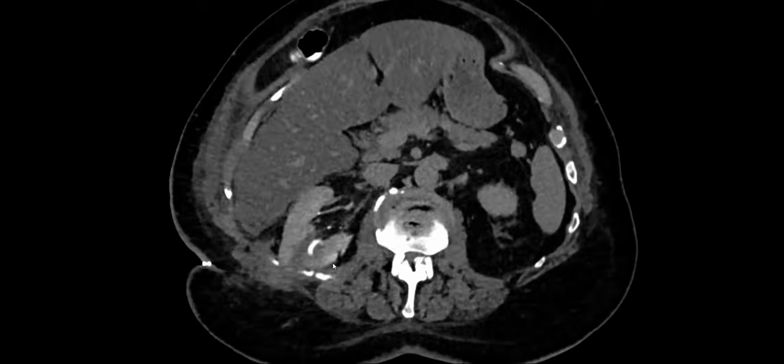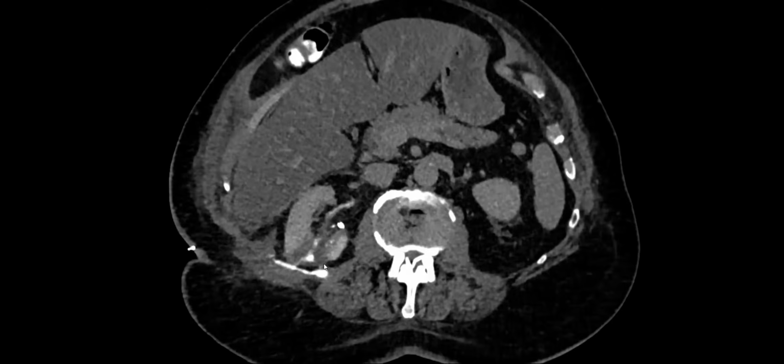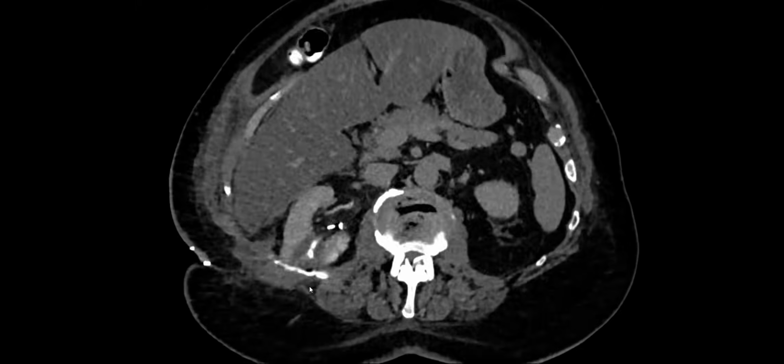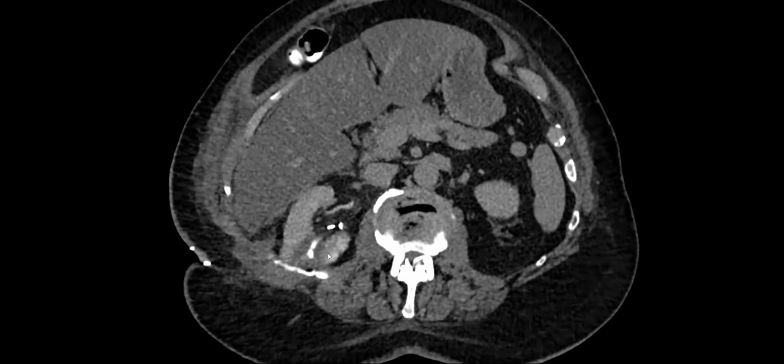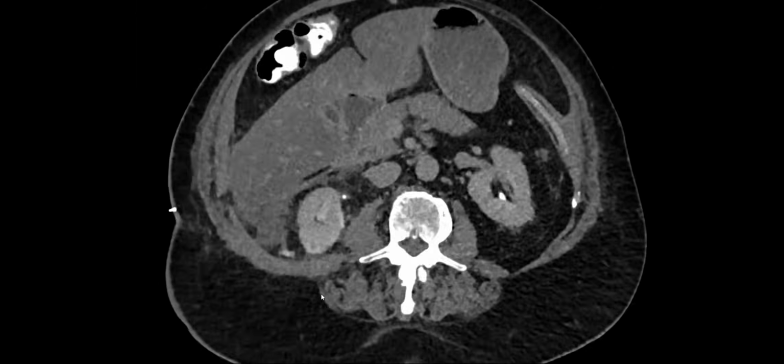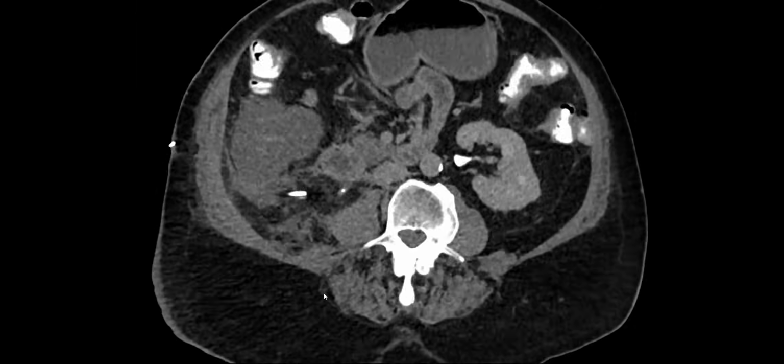I was also telling my residents, just for the students out there, even if you didn't protocol this as a urogram, if you're ever worried about a urine leak, you can always bring the patient back later that day or an hour later, including in trauma scans, because the contrast is going to be excreting for up to 12 to 18 hours afterwards, so you can see that leak even on a delayed scan. I've done that before, where it's a portal venous phase, and then I bring them back for a delayed scan, and then we can see the leak. Nice.